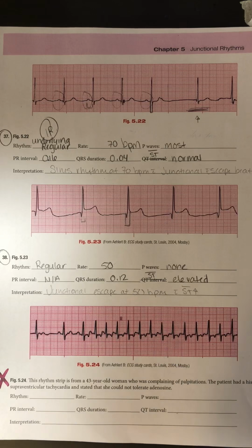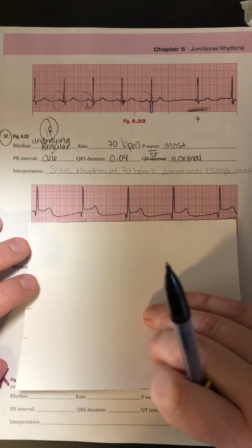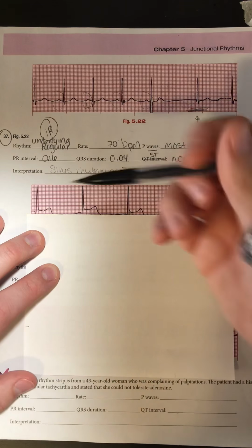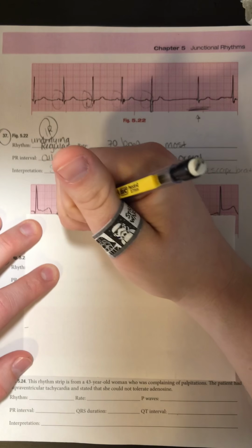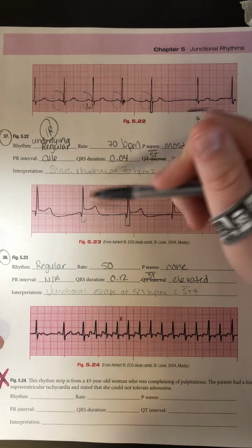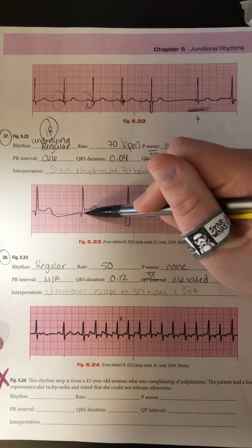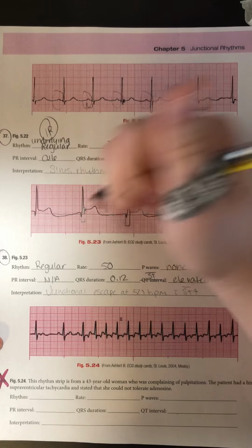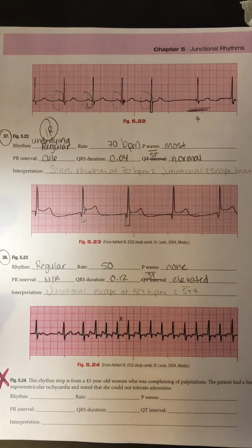And I definitely have some ST segment elevation here. If you are having trouble seeing that, just take your scrap paper, line it up to where the QRS complexes begin, since we don't have P waves and we can't use that as a measurement. That's my isoelectric line. And you can see definitely here we have 3 boxes of elevation right where the QRS complex ends, where our J point is, never goes back down to that isoelectric line, and that's indicative of a heart attack. So we definitely want to make sure we note that elevation.